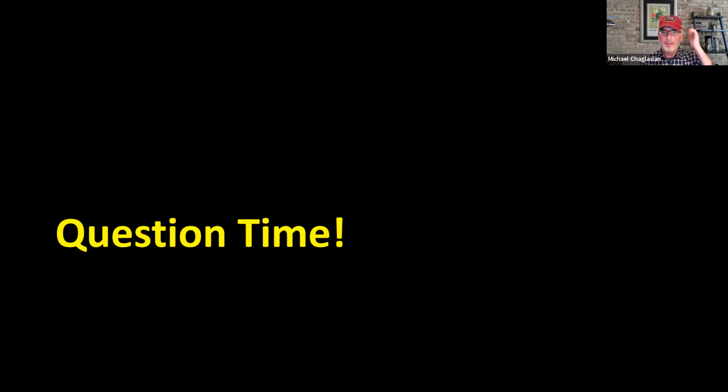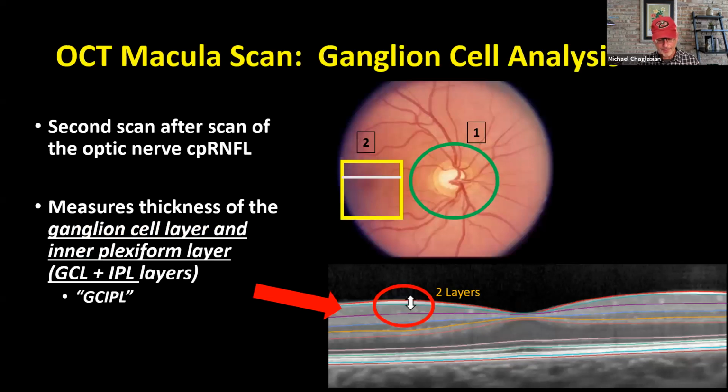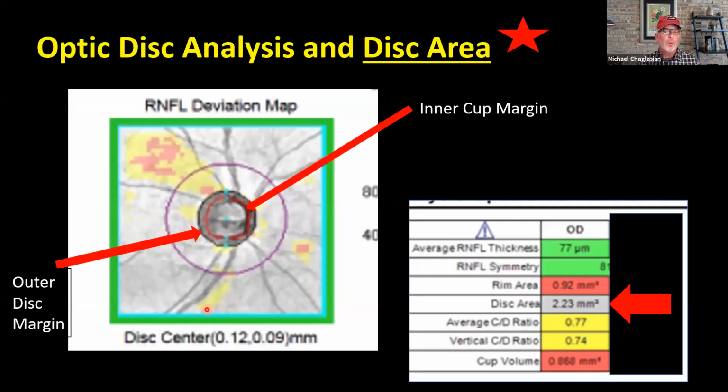I guess, Joe, part of what I was trying to get across on my earlier slides, and maybe I'll just back up for a second, is, why can't I move here? I'm blocked here for a second. Oh, here we go. This one doesn't show a notch, it just shows a generally enlarged cup.